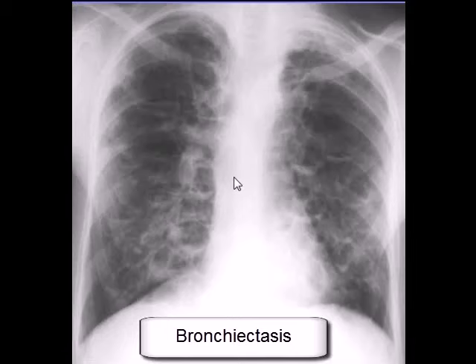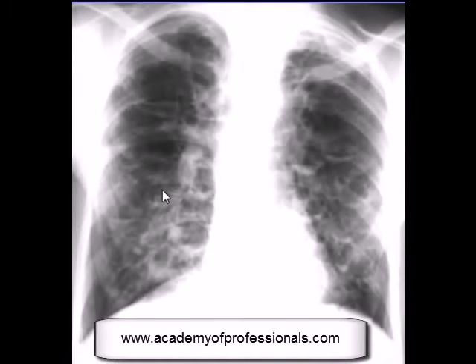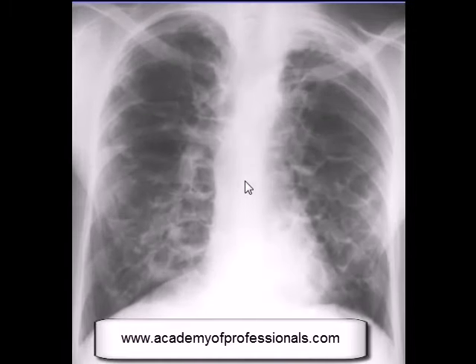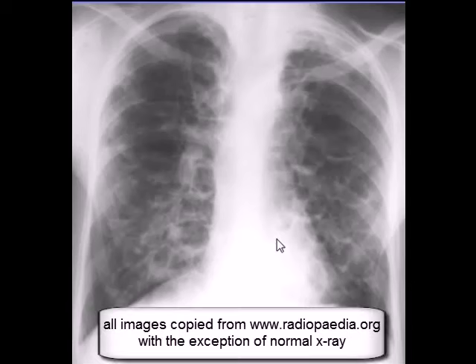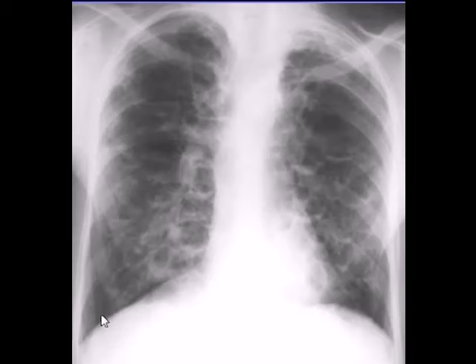Another chest x-ray, and have a good look at this chest x-ray in different window level settings. And you don't have to look too closely to tell that the x-ray was taken in erect position and is grossly abnormal. From radiology point of view, hardly any part of both lungs can be classified as normal other than this area and this bit, probably here as well.